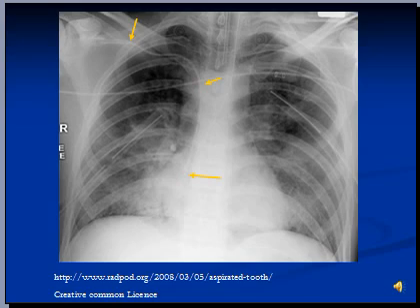The purpose of these lines is to have a direct access to a large vein to introduce a few medications which are not recommended through small veins, like dopamine, for example. CVP line, for example, is also used to measure central venous pressure. Porta catheter is inserted into cancer patients for a long-term access. A central line is also used to infuse concentrated solutions with decreased risk of complications.